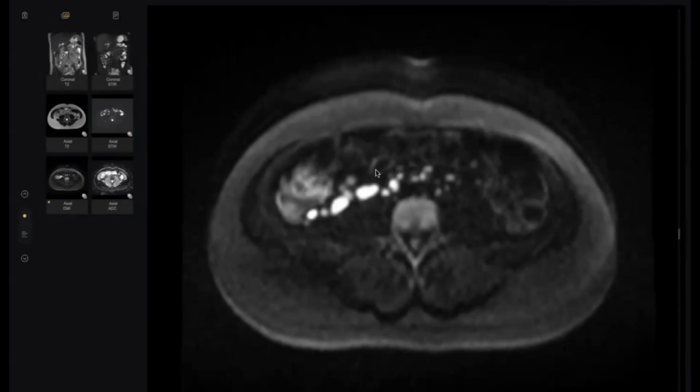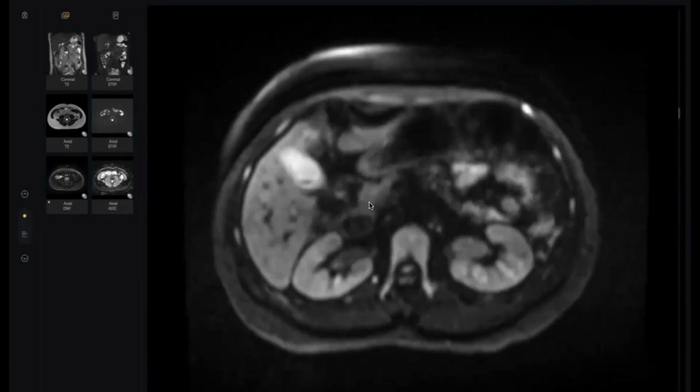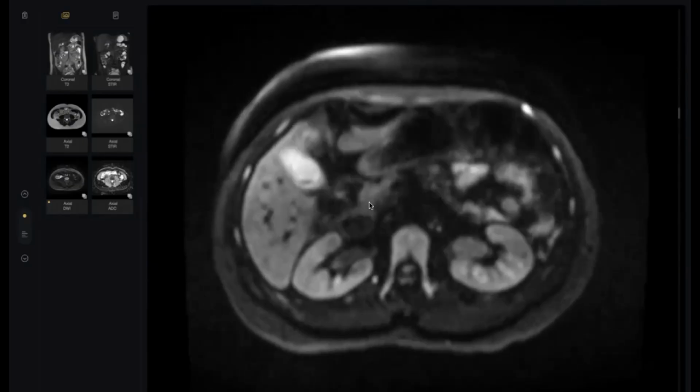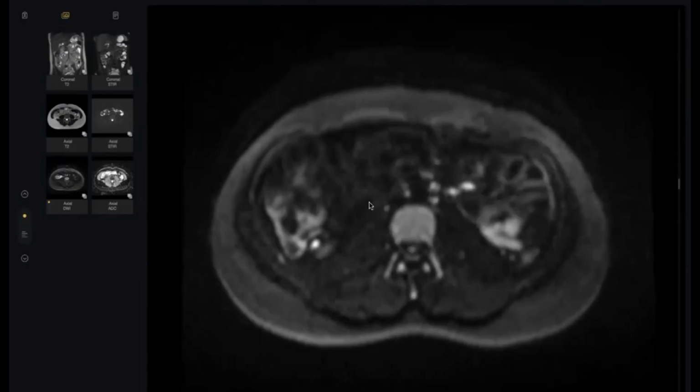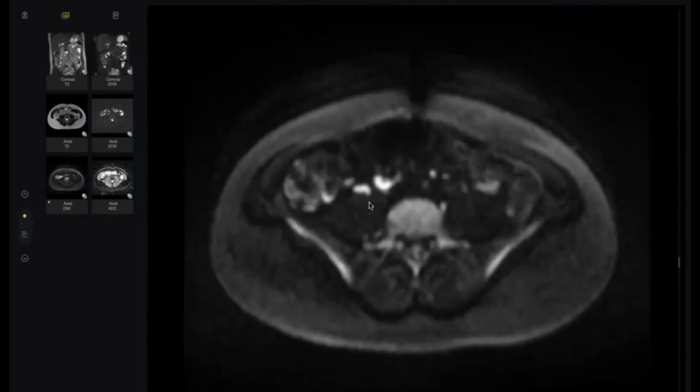Can you scroll a bit? Don't worry. What is your final diagnosis? So this could be a case of mesenteric adenitis. Excellent. What will you do next? Mesenteric adenitis is a self-limiting condition. I will ask the history of any previous viral infection.